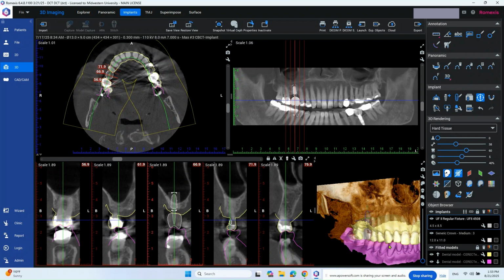So right now I just have the upper matching to the lower, but if you had an upper and lower, you definitely want the upper and lower in the CBCT plane, but then also bring in the other 2 again in articulation, so you know. Okay. Hopefully that helps. If you have any questions, come see me in my office, or talk to one of the surgeons. Once you're done with this is when you would be talking to your CCC about planning the implant and getting approval for your consult with the surgeons, whether it be a GBR or an implant placement.